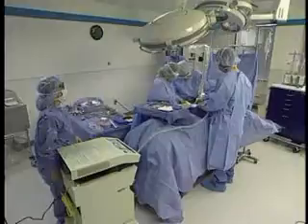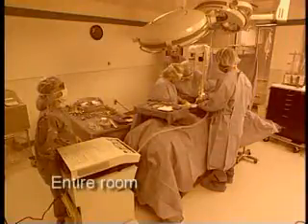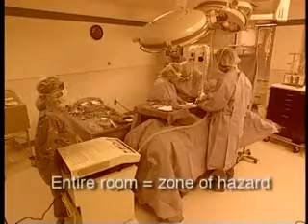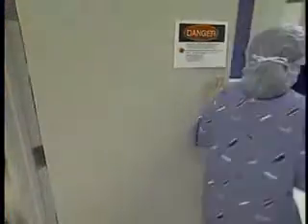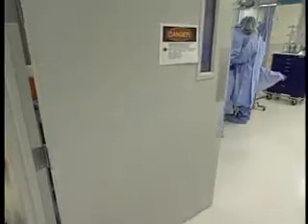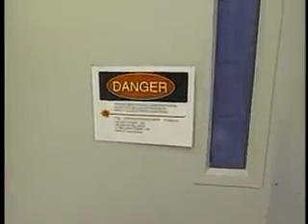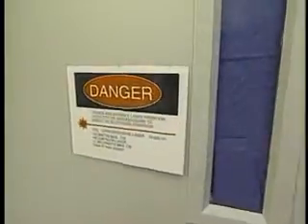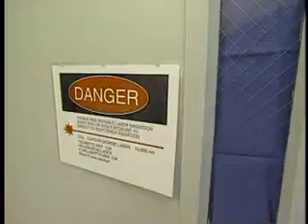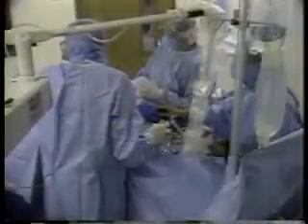Regulation signs should be placed on all entrances to the laser treatment areas. Window covering should be appropriate to the laser wavelength being used. For example, the glass of a window will stop the CO2 wavelength. However, it will not stop the argon or YAG beams and should be covered for those wavelengths. The eye is extremely sensitive to laser energy. Following the standards and recommended practices is critical to the safety of personnel and patients.